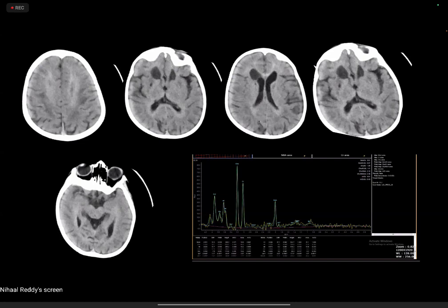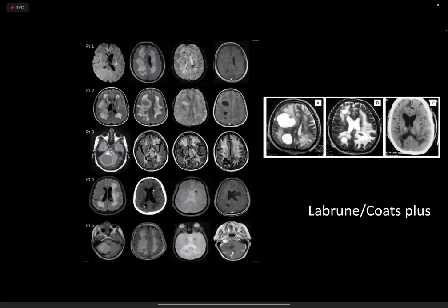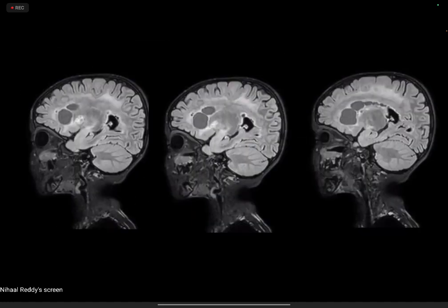They usually are hypodense. Also, that thing along the frontal region, what we have called cysts, the density of that is quite unusual. At least the cysts we have seen in mitochondrial disorders are usually more CSF-like. I thought maybe Labrune, but there was no calcification. Was there an infection to start with? No. Exactly, I think somebody said the cysts look like trapped ventricles. In a way, they do. That's what we get with infections, and so we thought about that.